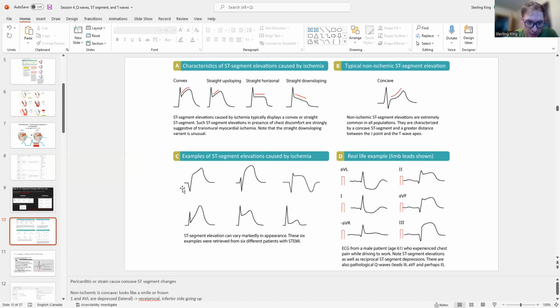Looking at the ST segment itself. So if we're looking at this ST segment, we have this flat part, and then the Q, and then here we had the R. And then it just goes over to this T wave. We know this part's the T wave because it repolarizes and comes down. But there's this subtlety between it going straight and then slightly curving over. That's your ST change. That's your ST elevation. So here it's right there.